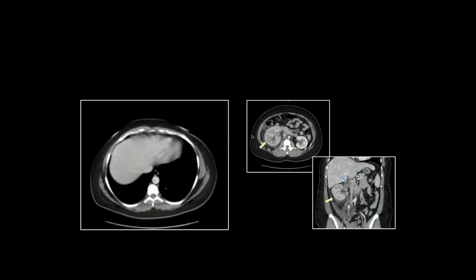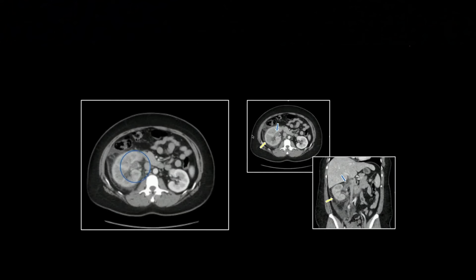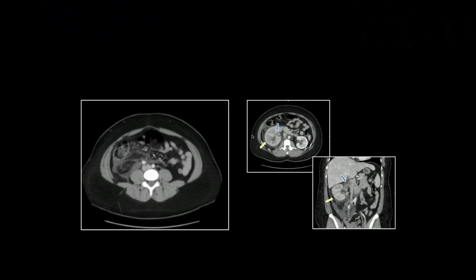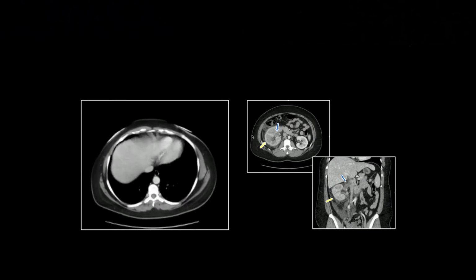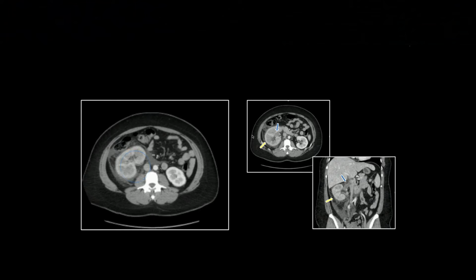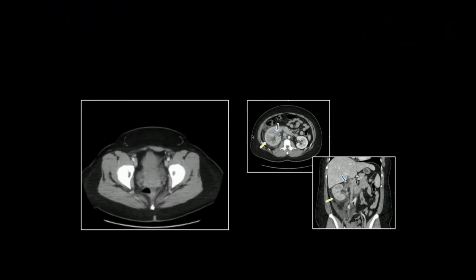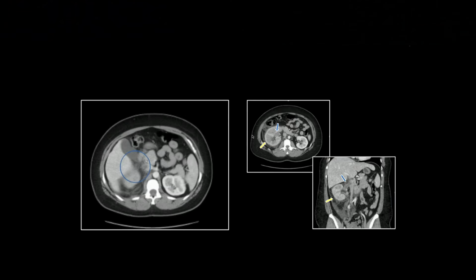And certainly these can embolize just like any venous clot. They don't just stay there. I've seen any number of cases of renal vein thrombosis actually presenting with pulmonary embolism. So there's that filling defect, and you can see very nicely that extension into the IVC. Right there.